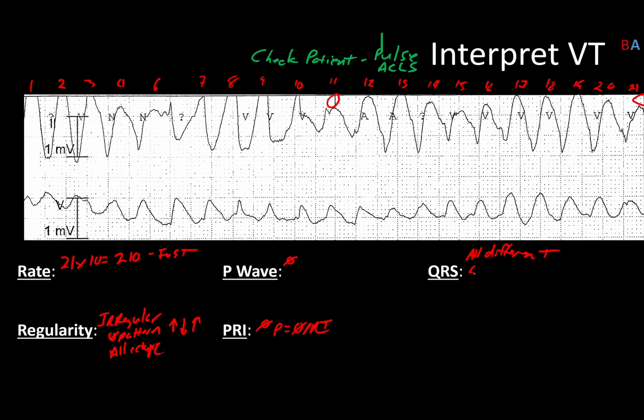I've got the change in amplitude. I've got the change in direction. You know, I don't really have a change in direction. It's more that some of these get a little bit more blunted at the top rather than nice and sharp like their counterparts are. So I can't quite say that, but I definitely have an amplitude and an overall style change with each one.